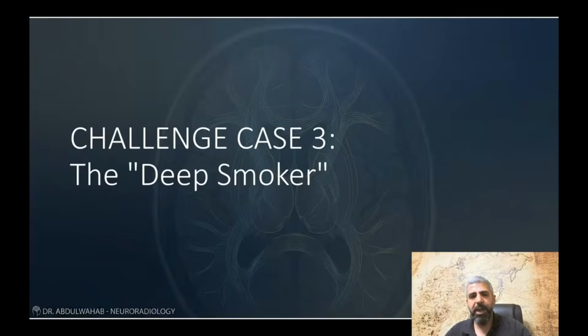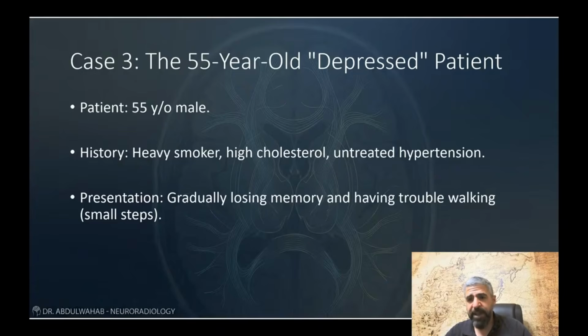Challenge case number 3. It's the deep smoker. Case number 3, our final case. The history is very common. This patient isn't acutely sick. He's just slowing down. His walk is magnetic, the feet stuck to the floor. Is it just aging? He's 55 years old.